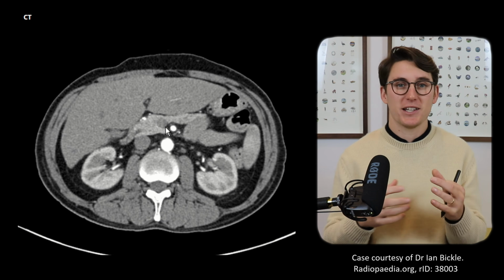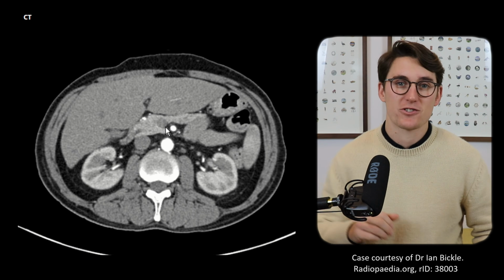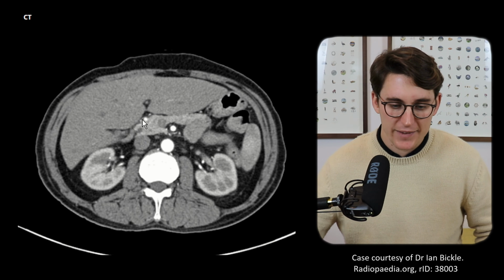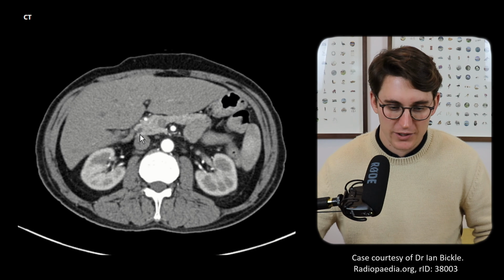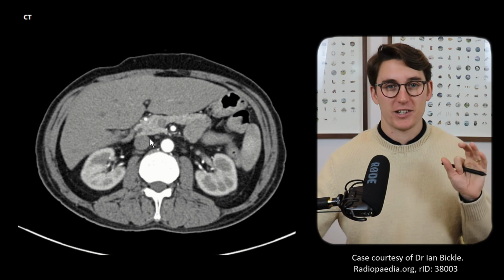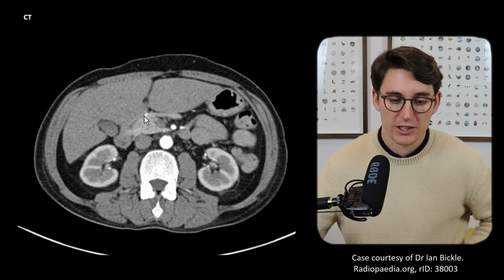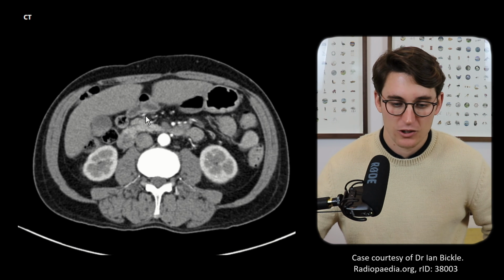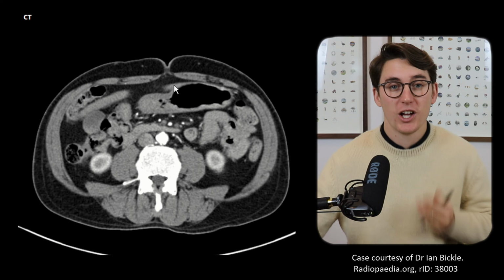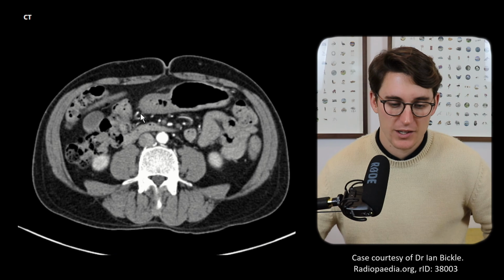And a lot of this anatomy is variable amongst patients. So here our right gastric artery is coming off our gastroduodenal and not off the common hepatic itself, but we can still see it there. And then we can see a small branch coming off here, going backwards, and that is our superior pancreatoduodenal artery that we looked at in our diagram, supplying the duodenum and the pancreatic head there. We can follow that gastroduodenal artery all the way down. Let's follow it. It takes a long course, and we know that that terminates in our right gastroepiploic artery, going around the stomach there, supplying the rest of the greater curvature of the stomach.